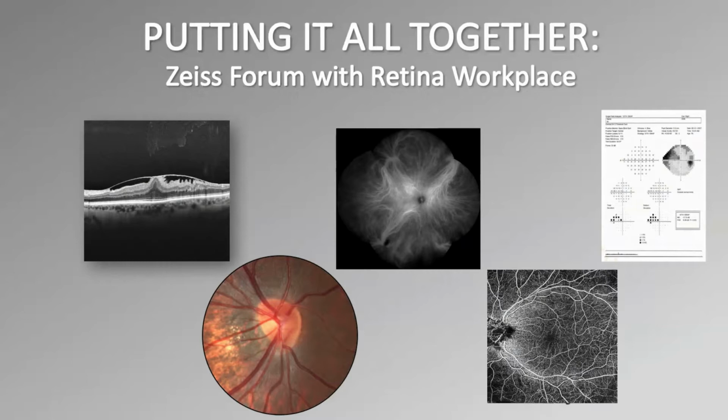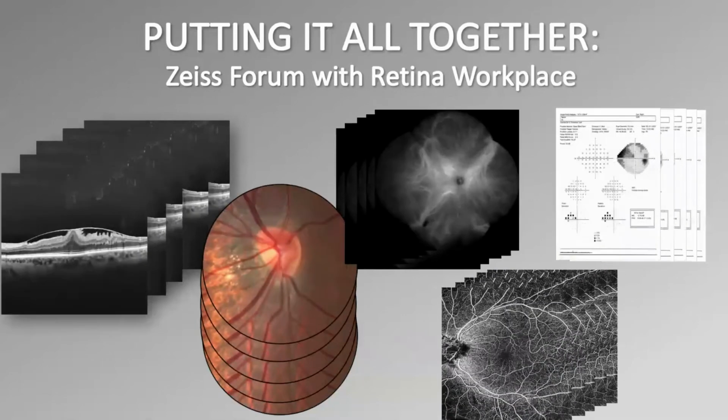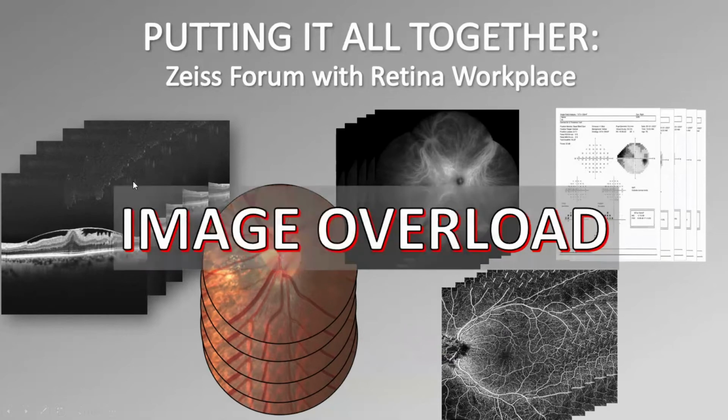That's a great aspect of these devices, but one of the downsides is it does end up generating a lot of usable images. Whether it's a 12 millimeter HD one-line scan or a 12 by 12 millimeter OCTA study on the Cirrus, or a wide field ICG or fluorescein angiogram on the Clarus 700, you end up having to spend a lot of time working through all these images that you've obtained. This can lead to a problem that I've coined image overload.